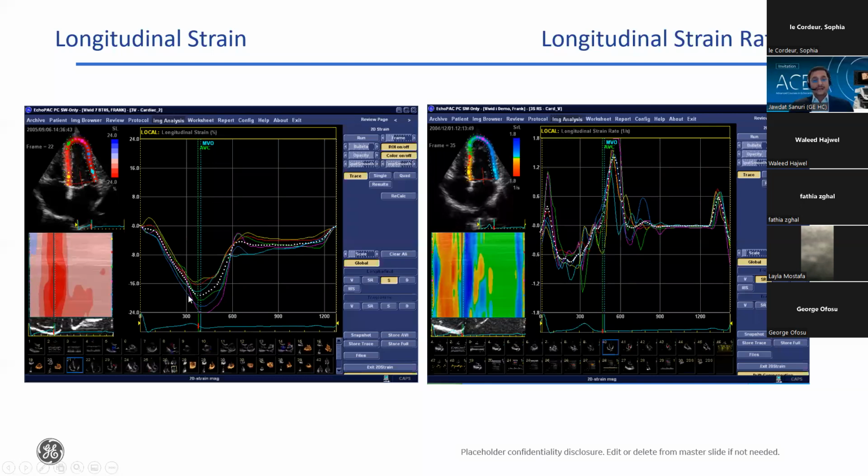Depends also on the values of the strain itself, because usually if it's a post-systolic shortening, you'll have a lesser slope here, and then it keeps going on until beyond systole. But if it is simple asynchrony, you will have more or less the same waveform, but with a time shift altogether. The onset of it and the end of it will be changing. So that's another way to look at it.